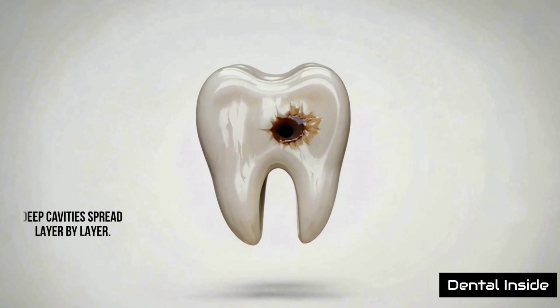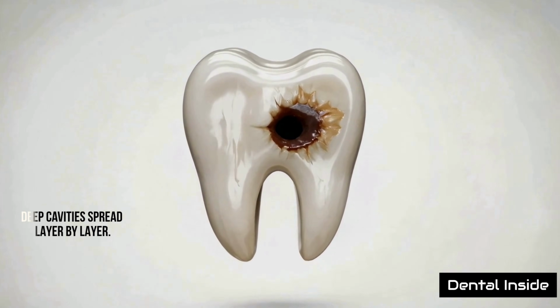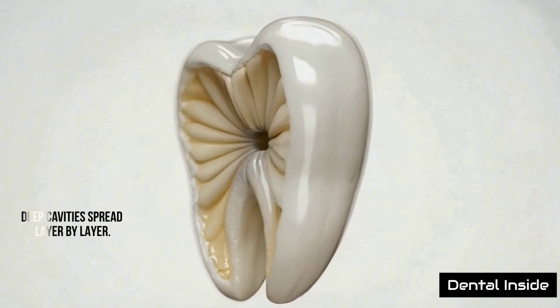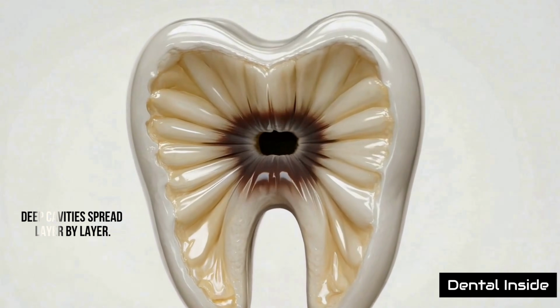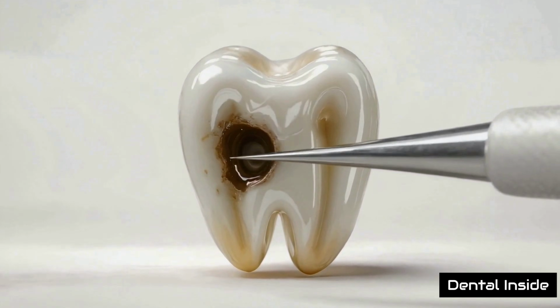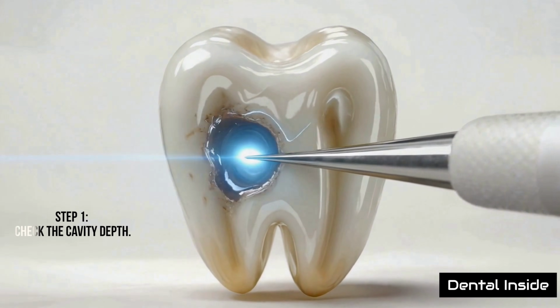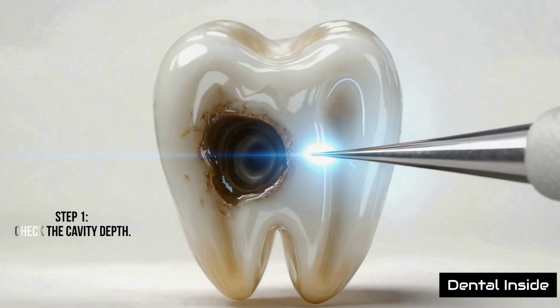Deep cavities do not appear overnight. Decay slowly breaks enamel, then spreads into the softer dentin underneath. First, a dentist checks how far the cavity has traveled, often using exam tools and dental X-rays.